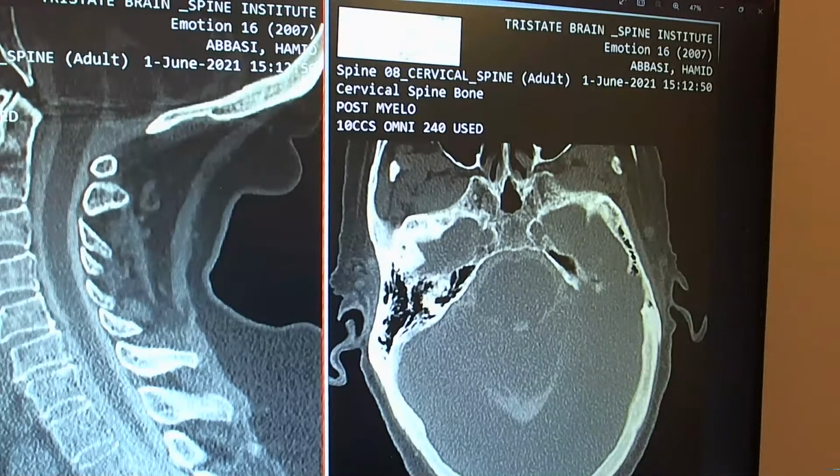Dark lines, which indicate there is air, and obviously this seems to be very dense bone. What is this dense bone called first? Air cavities. These are air cavities in what bone? What is the bone here called? Mastoid cells. Perfect. Well, Christina is killing it today.